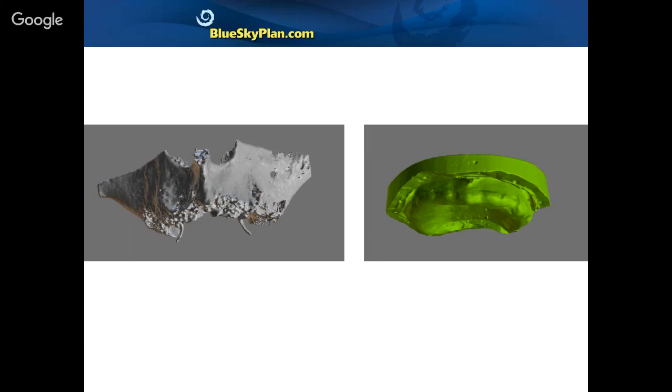In addition, we need to know the future tooth positioning in order to plan the implants based on where the restoration is going to be. And we don't have that as well. In some situations, we could segment the bone and create a bone-supported surgical guide. But even if we create a surgical guide based on the bone segmentation, we of course need to know the future positioning of the patient's teeth.